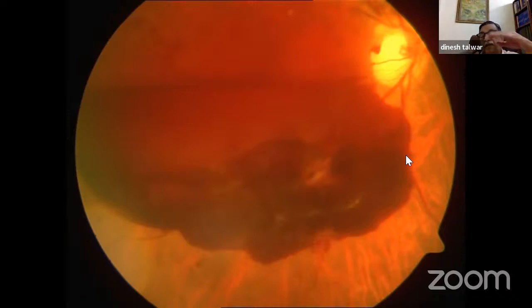Wherever it's denser, it's cutting off fully. If it's not denser, it's not fully cutting off. So this can also happen. It can confuse you. But you have to look at this part. This is very clear. The lower part is denser and the vessel is below, and above that is the hemorrhage, because the hemorrhage is obliterating the vessel.